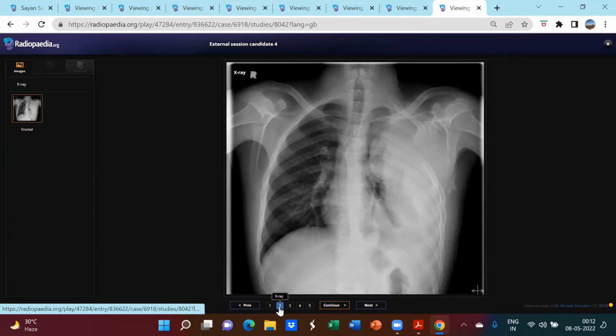So, chest radiograph frontal projection of a young patient presenting with chest discomfort that shows a large opacity occupying a greater part of the left hemithorax, the upper, mid, and lower zones. The overlying left second and third ribs are deformed and partly deficient. The rest of the ribs are unremarkable. The left CP angle is obscured. There is no significant mediastinal shift.